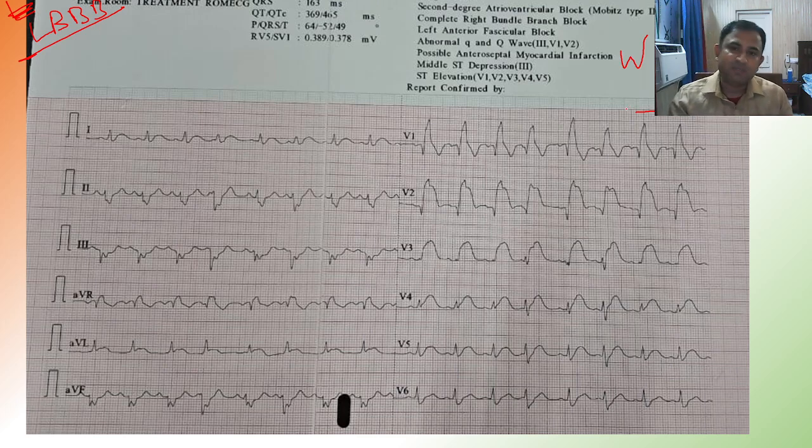However, because he has presented with a chest pain, we had to relook at this ECG, and you find that there is a Q wave over here, a small Q followed by this M pattern. Okay, so when you get an established qRBBB, it is suggestive of a massive anterior wall MI. Massive anterior wall MI. In majority of the cases, proximal LAD is blocked.